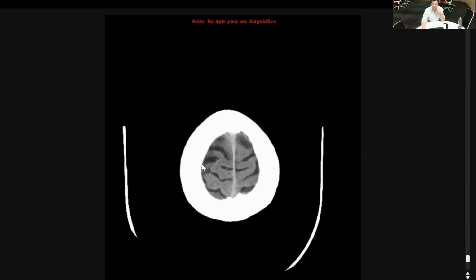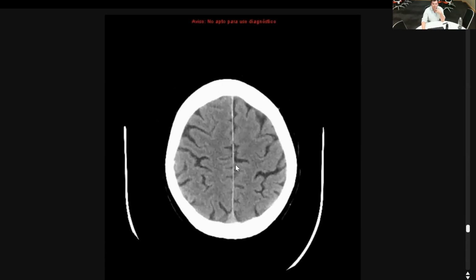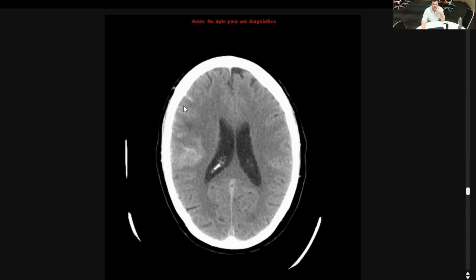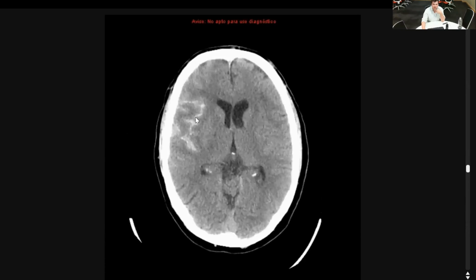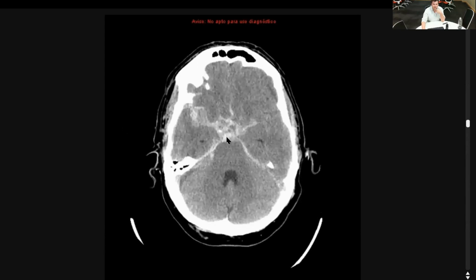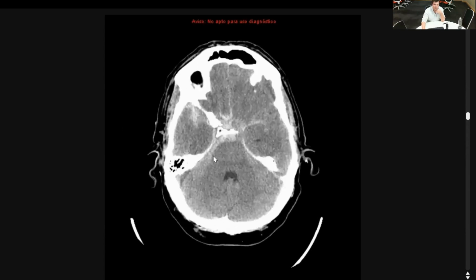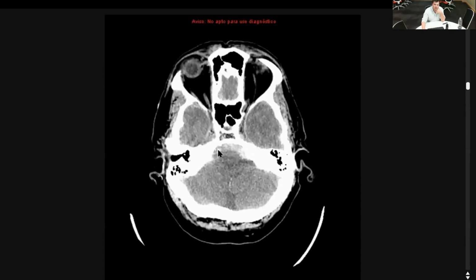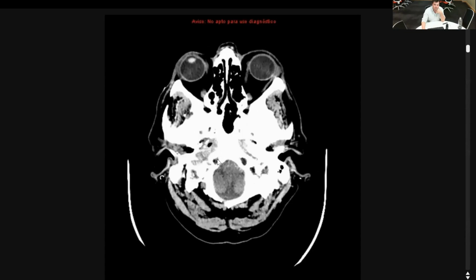So when you come right up to the top of the brain, things look okay down there. We don't have any peripheral blood, or you sometimes get traumatic subarachnoid blood hiding in the sulci right up the top. But we start to see we've got a bit of swelling here because we've still got CSF in this side. We've got blood filling in the CSF spaces here, filling in the Sylvian fissure, big blob there, and then all this blood swilling around this patient's basal cisterns. And you can keep tracking it down into the posterior fossa. You can see it surrounding the brainstem all the way down here.